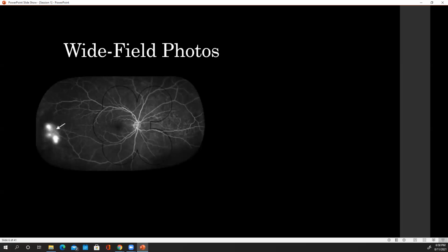So this shows you obviously the benefit of wide field, but I just want you to keep in mind that the studies you use, the dogmatic things we put in print that you have to read, have these sorts of situations that you have to keep in mind, and it gives you more context for why things are the way they are.